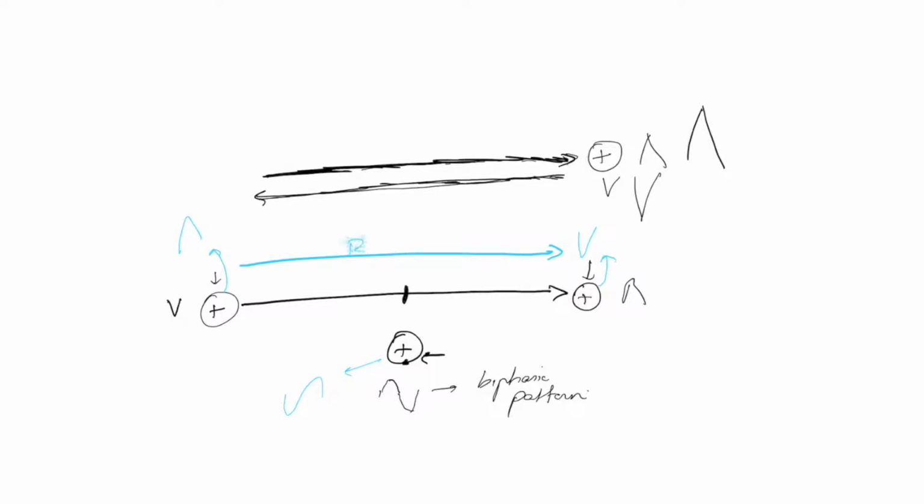So this would be repolarization, and this would be depolarization.